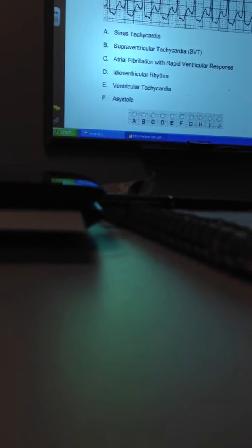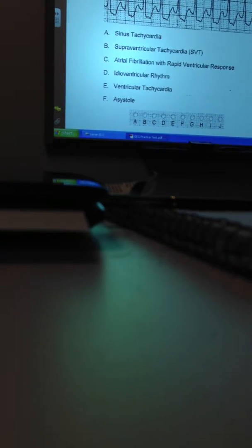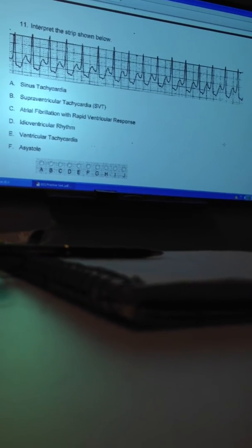So do you see P waves? Is that a P wave? Isn't that the big dot? That's a T. Okay. No P wave. It could be inside these T waves, but it's coming in so fast. We know the rate is probably above 150.